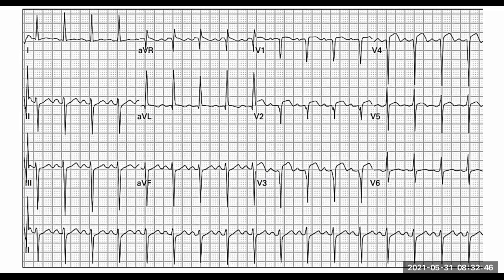Right? Then we're going to look at the lateral side of the heart. So which four make up the lateral side? V5, V6, and which other ones? Come on. These are the lateral leads, which are the high lateral leads, 1 and AVL. Okay, don't forget that. All right. So remember, these four must look similar. Okay, but let's look at V5 and V6. Do we notice anything? Do we see anything?